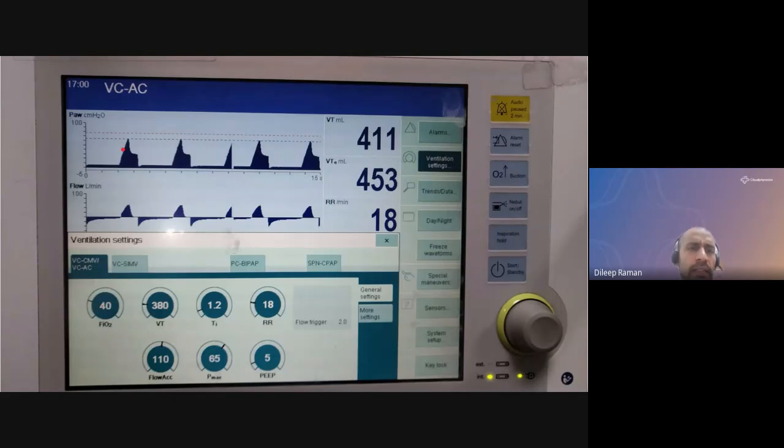And like somebody is commenting, there is a gap. There's a big drop from the peak and the plateau, if we can call this a true peak pressure, which again we will come to and I'll explain. But what is happening here is that there is a little bit of excess exhaled tidal volume by about 50 cc. That may be explained by air trapping potentially, where the trapped air is coming out during exhalation and adding to the exhaled tidal volume. Inhaled tidal volume is around 410, very close to the set tidal volume. So you can see that changing flow ACC is doing something to the ventilator.